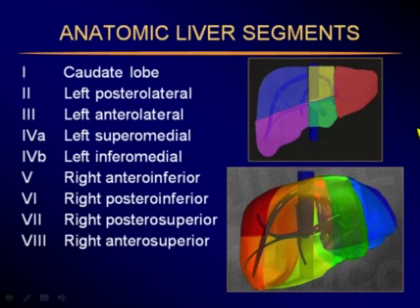All of that put together helps us subdivide the liver into subsegments, which is very useful for the surgeon, because if we can place a lesion in a specific segment, the surgeon can then go after that lesion and remove it without harming other vascular supplied segments of the liver. This is the basis of the Couinaud system, a French system that divides the liver into 8 segments.